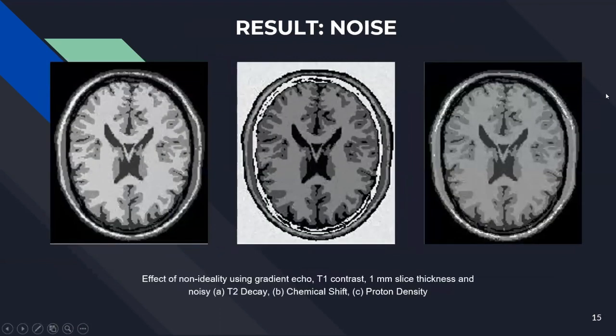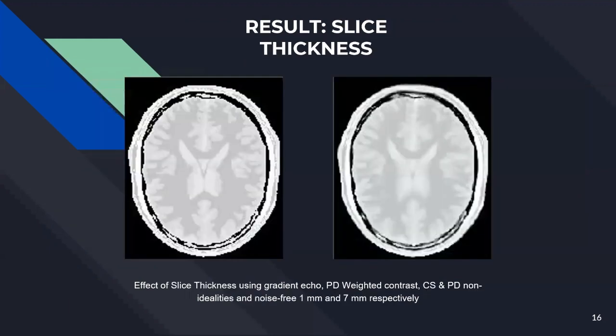And also the effect of the noise can be seen especially at the background, especially at the T2 weighted contrast. Also, when these images are compared to their noise-free versions, images are highly distorted inside the brain. For the effect of slice thickness, we used a 1 millimeter cube model brain, and to see the effect of thickness, odd values of 3, 5, and 7 are tried.